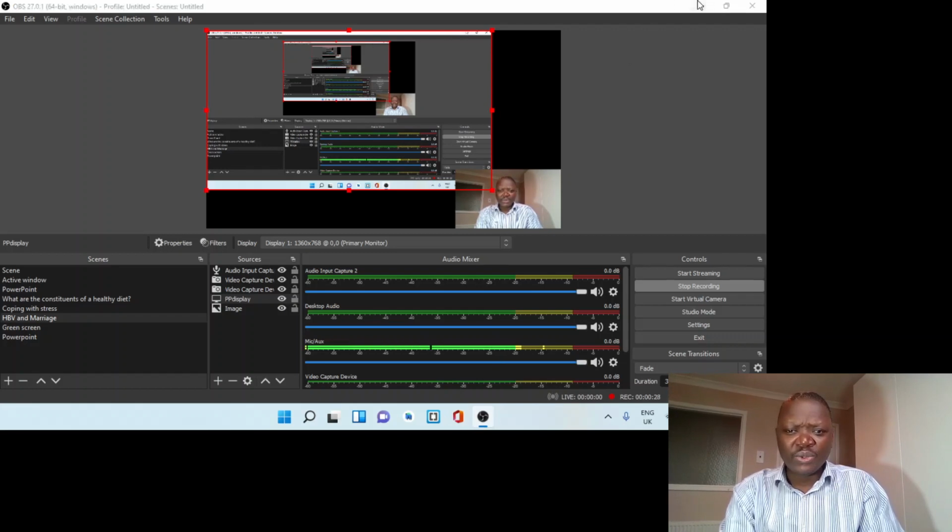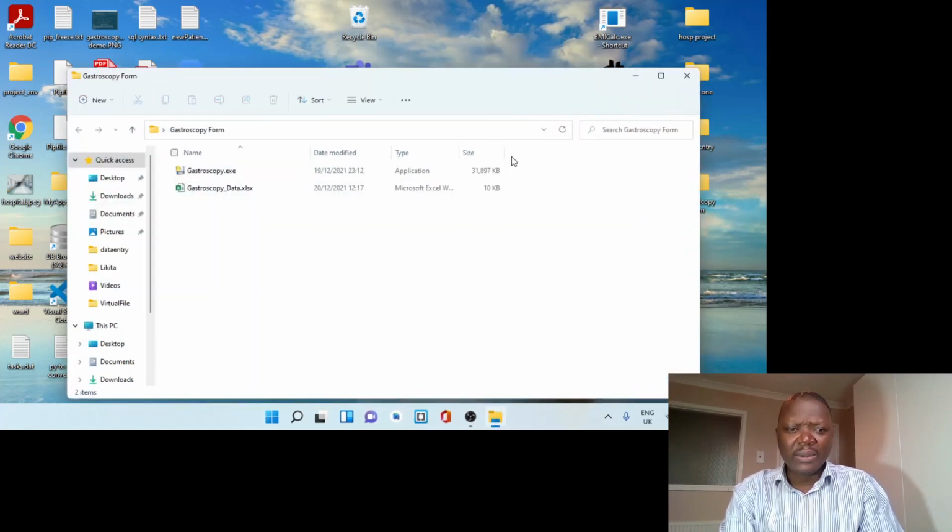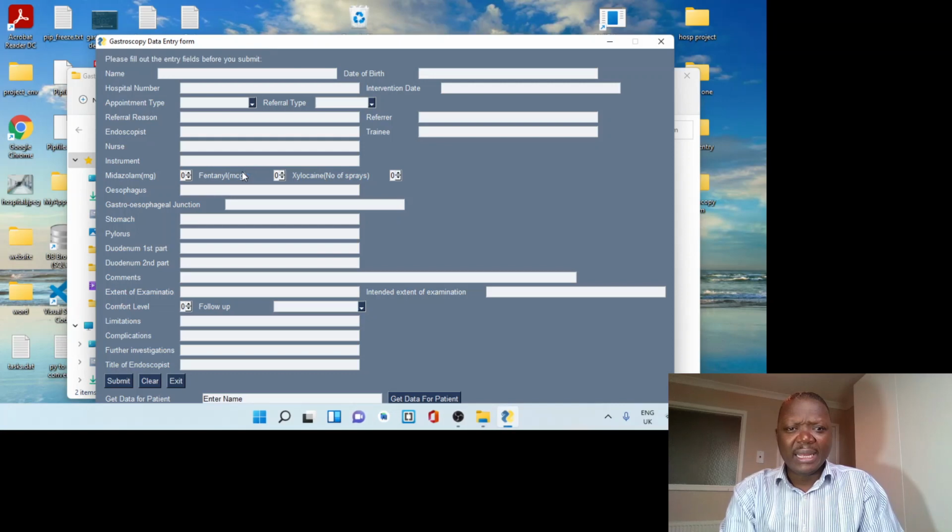I'll take you to my desktop now, which is where this is known as gastroscopy form. I will click on that here. It will open shortly, gastroscopy executable file, and there it is.